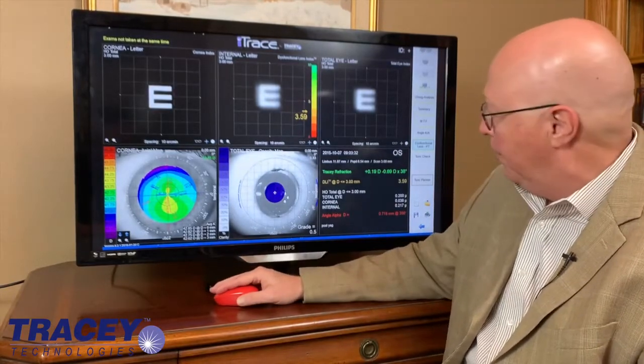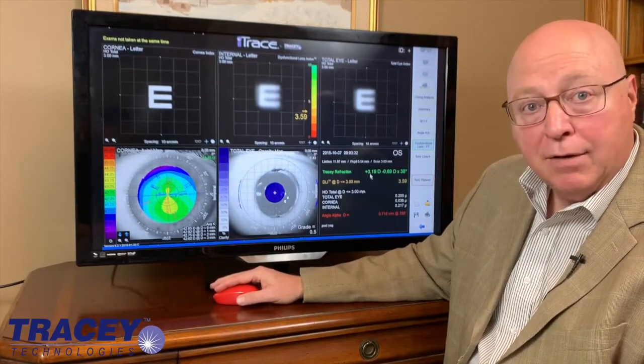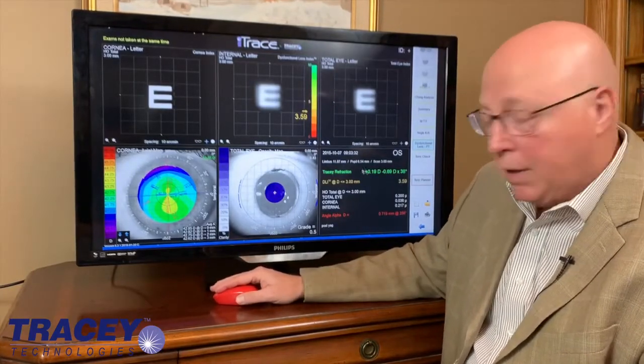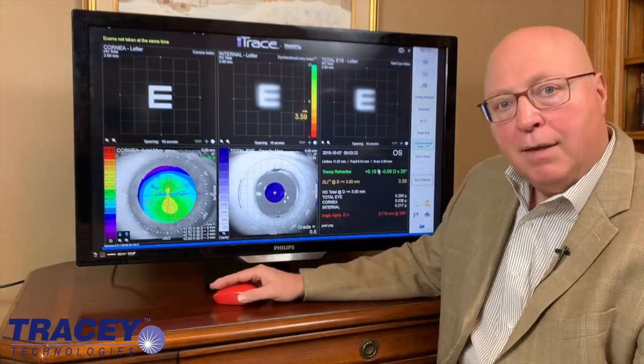I was told that that's probably because of all the laser energy in the eye, that the eye would quiet and clean up. But now look, the refraction's not in red anymore, it's in green. And now that minus 1.5 diopters of nearsightedness and the astigmatism, now this is easily correctable with glasses. So they're going to be plano with a little bit of cyl, which they'll easily tolerate. And they're going to be super happy by the time this resolves.